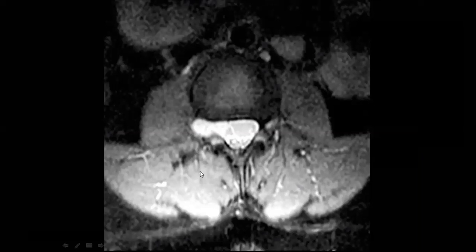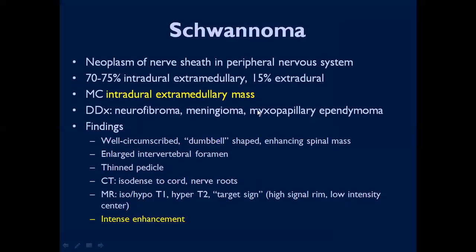So take care, which sequence are you in? If you are in this sequence with fat suppression, already it cannot be fat, okay? So one of the differentials can include Schwannoma, sure, or cyst, or meningioma, it depends. Dr. Nermin, yes, lateral meningocele, it can be, but without enhancement. But this one has intense enhancement. So in this case, you think Schwannoma, one of the important things.